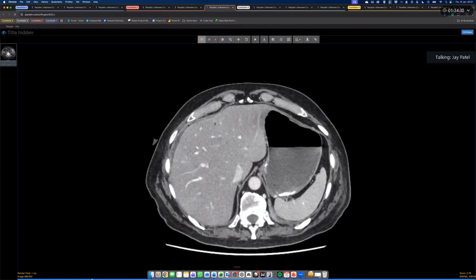So that's relatively evidence-based, but beyond that, it's not great. However, subjectively, this is more air than you would expect 6 days post-laparotomy. As a point of education, not necessarily as a point that you should pick up for the exam.